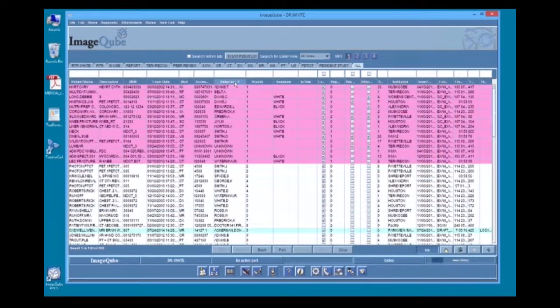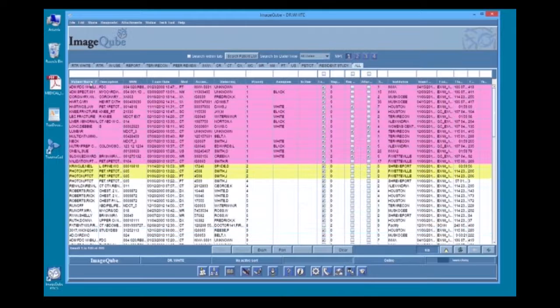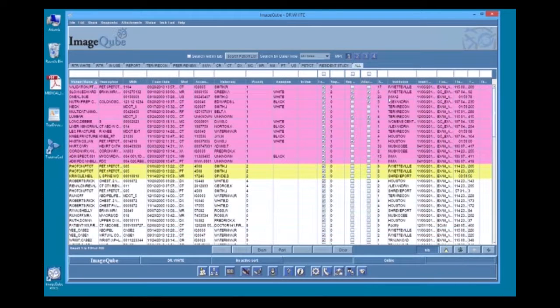Priority levels may change by users who are given permission to modify priority level.